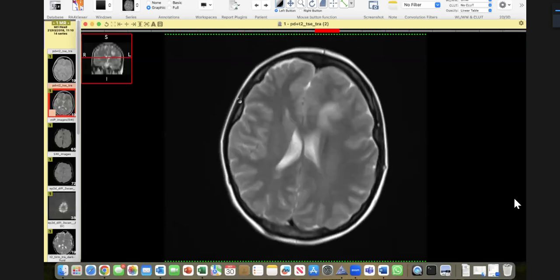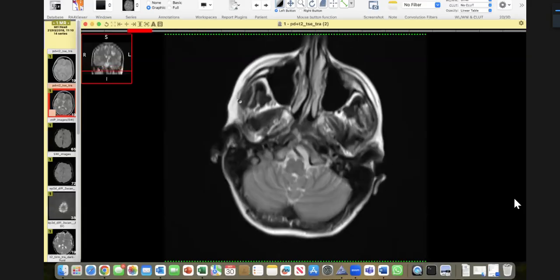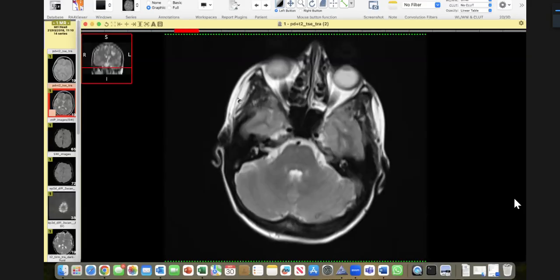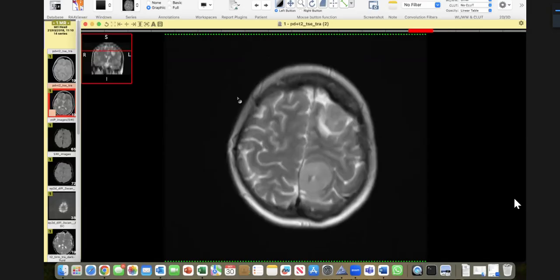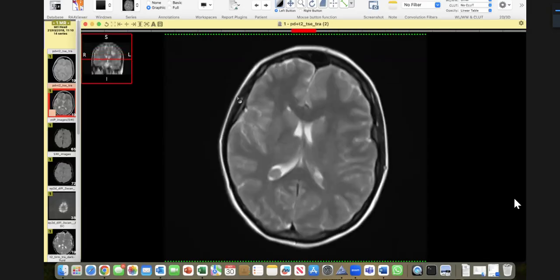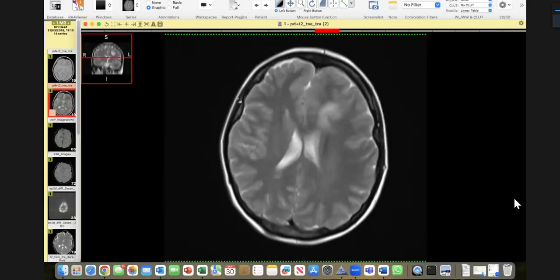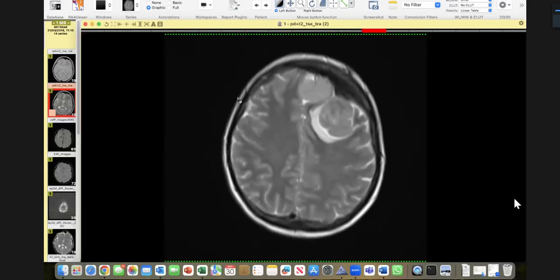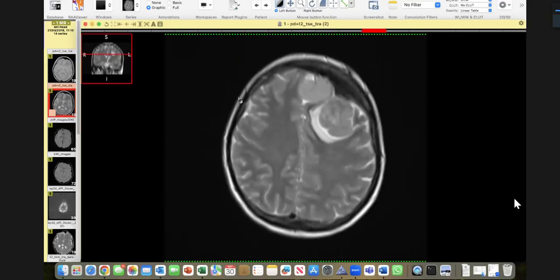So these are multifocal, intraventricular as well as extra-axial, predominantly left frontoparietal region altered signal intensity areas appearing to be iso to hyperintense on T2 with surrounding CSF cleft around the larger ones, causing mass effect on the surrounding structures, but I could not appreciate any hydrocephalus.